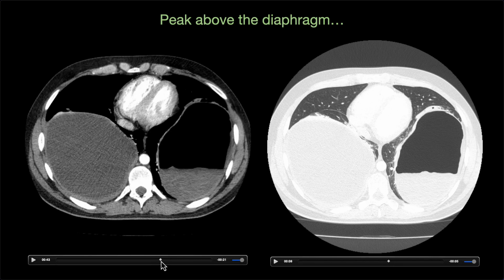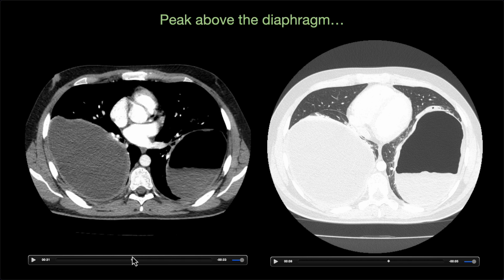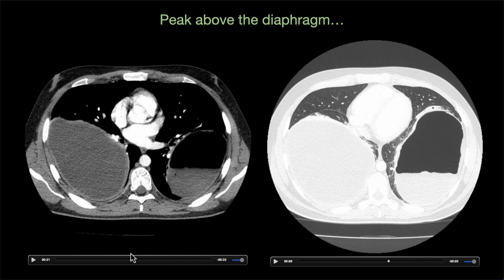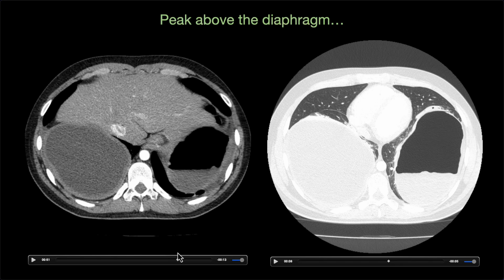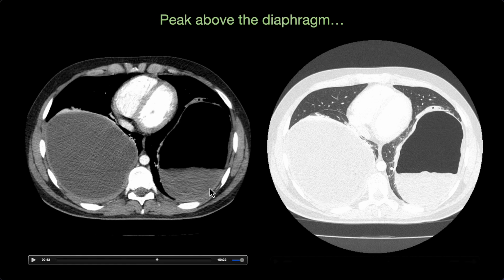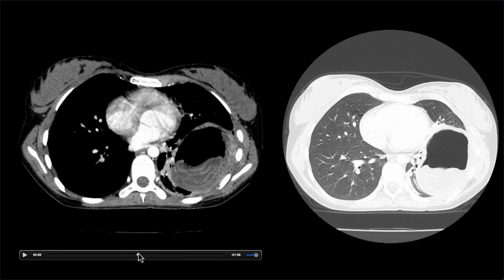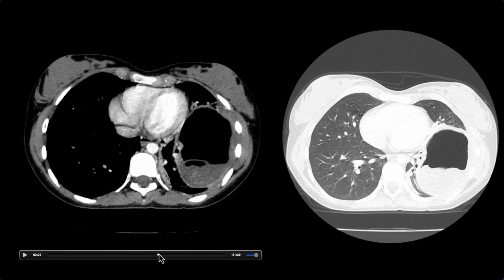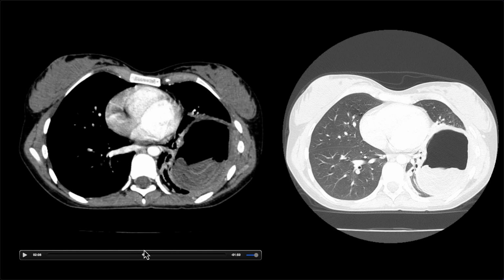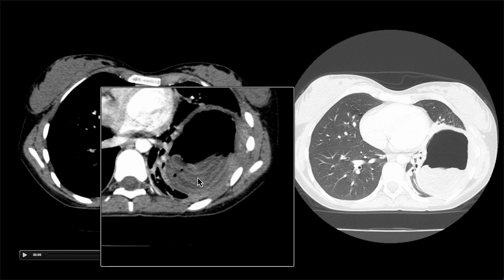This can cause the patient to present with hemoptysis and also white contents as they cough up the cyst. And if you look carefully, you can see the fallen endocyst membrane within that air fluid level cavity in the left lower lobe. And we'll look at a couple more examples of that. In this case, we see another large hydatid cyst that is ruptured in the left lower lobe and can really appreciate the architecture of that endocyst membrane that has fallen and collapsed within the posterior part of that cyst here.